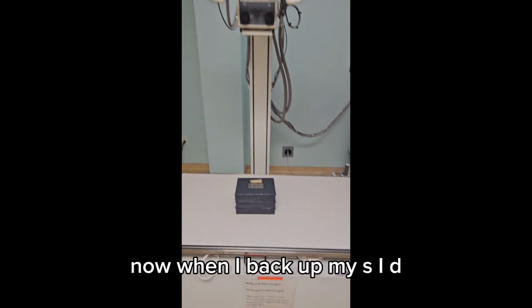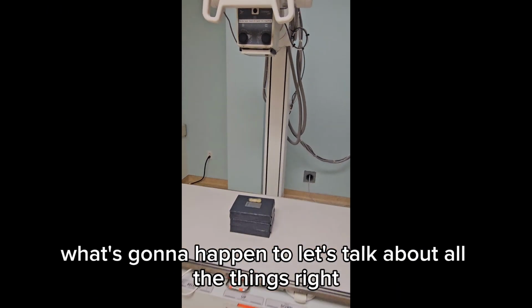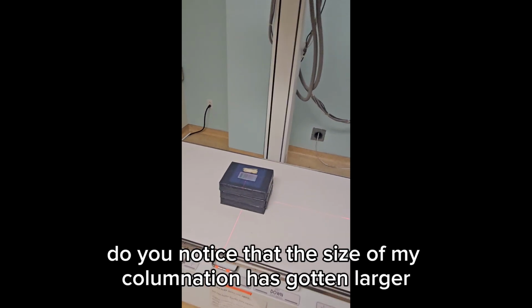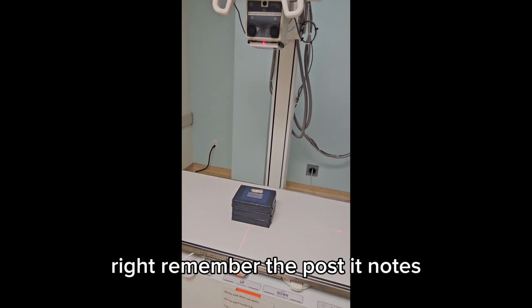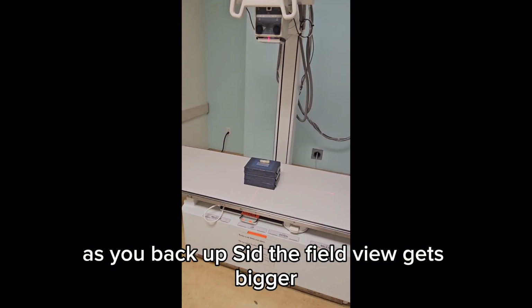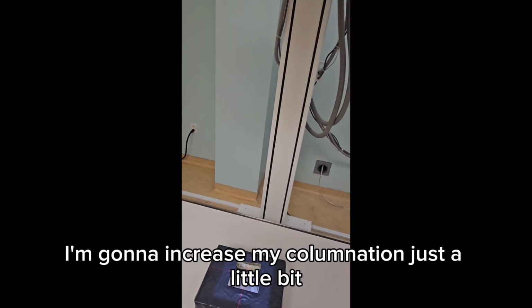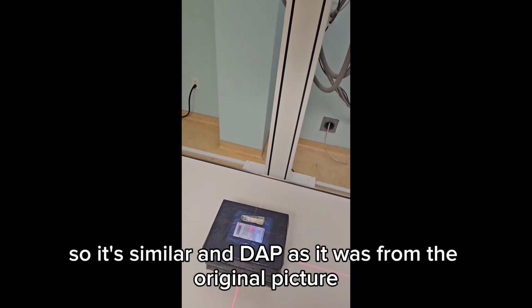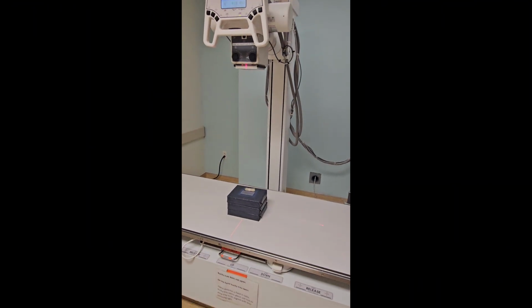Now, when I back up my SID, what's going to happen? Let's talk about all the things, right? First off, do you notice that the size of my collimation has gotten larger? Remember the Post-it notes? As you back up SID, the field view gets bigger, but it's going to lose intensity. So because I don't want to mess that up, I'm going to increase my collimation just a little bit, make it a little bit tighter so it's similar in depth as it was from the original picture.